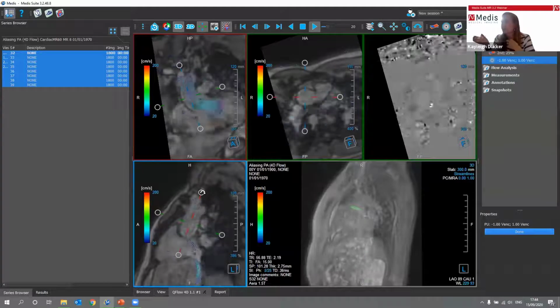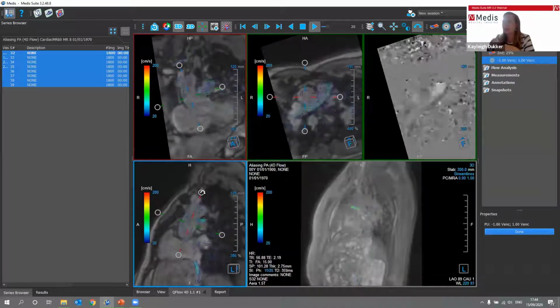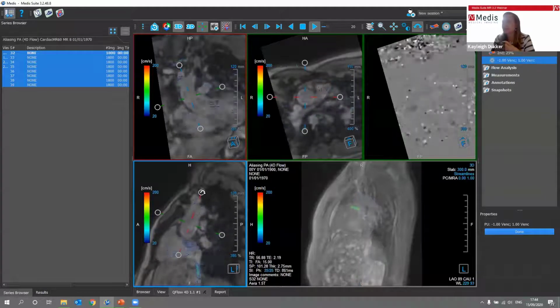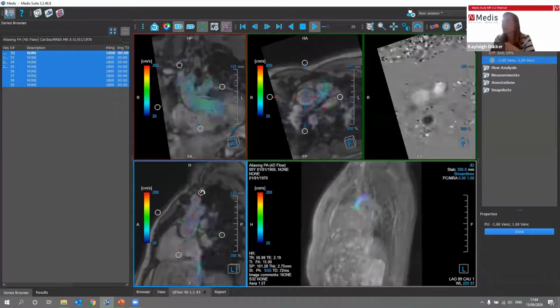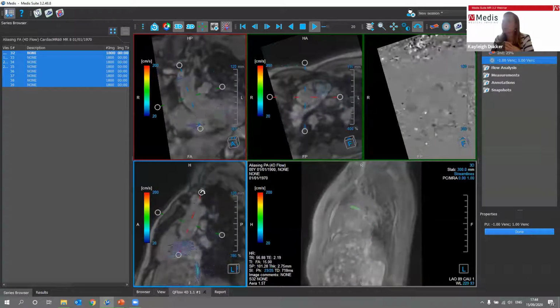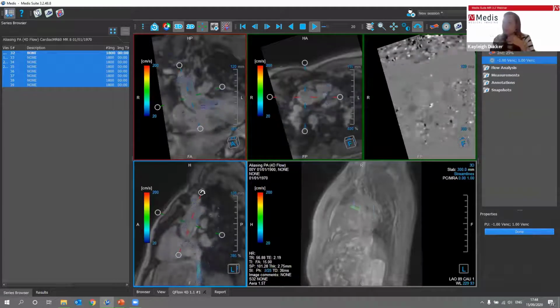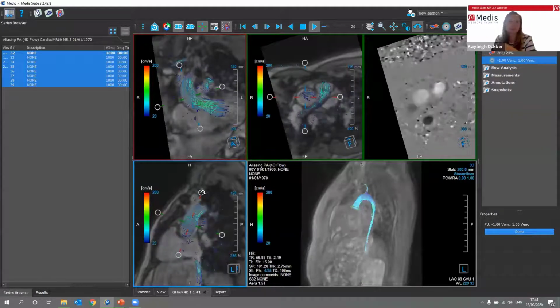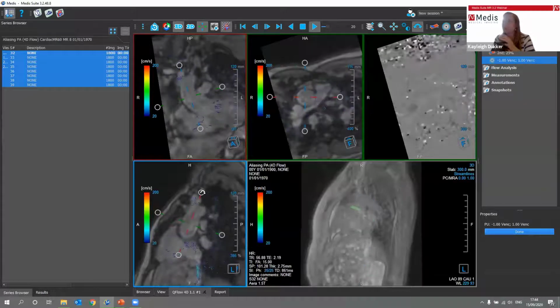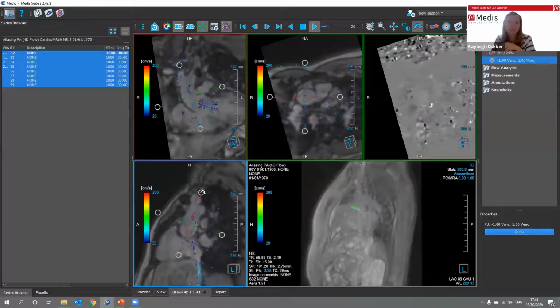If you are doing your measurements and you only find out with the last one that there is aliasing in there, and you still do it afterwards, it will update all the results of the previous done analysis. So both ways will work, I would say. Either do it when you face it or when you want to do it upfront.